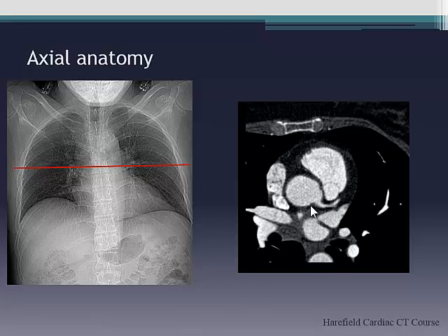So you line up with the aortic valve, and then it becomes much easier to identify the appropriate cusps, and then the appropriate sinuses, and then to identify whether it's normal coronary anatomy or not. It can be a bit tricky sometimes off the axial, but you'll get used to looking at it from the axial. So for those of you who do MR, it's quite helpful because it saves you having to load it into a workstation to look at it in 3D.